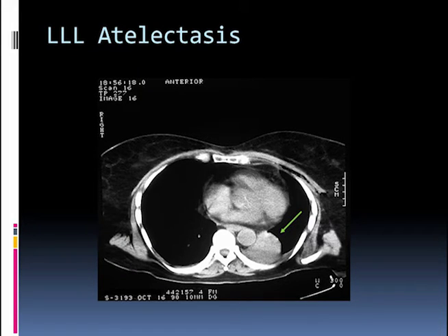If we do a CT scan of that patient, you can see that the collapsed lung tends to sit in the left lower lobe, tends to sit posteriorly against the posterior chest wall and aorta. In this particular case, there's also evidence of volume loss, and the mediastinum is shifted over towards that left side.